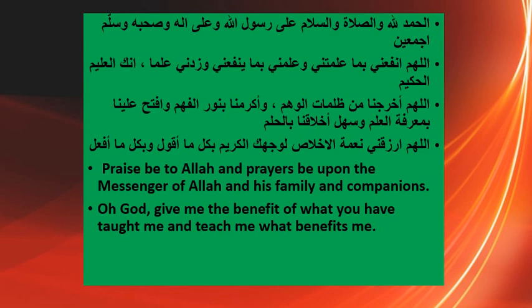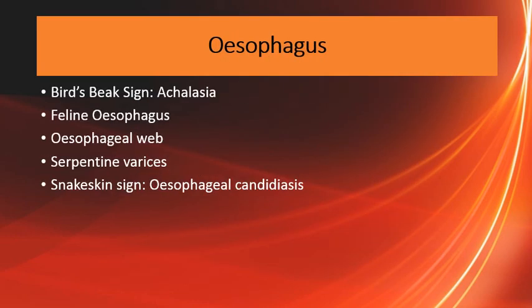My topic today is about the useful animal signs in body imaging. I have collected here some animal signs that are useful in body imaging, hoping you like the video. The signs of the esophagus: I will discuss some examples of these signs.